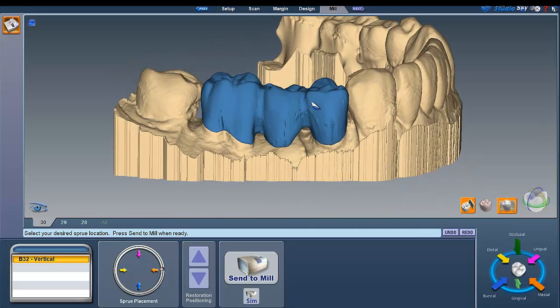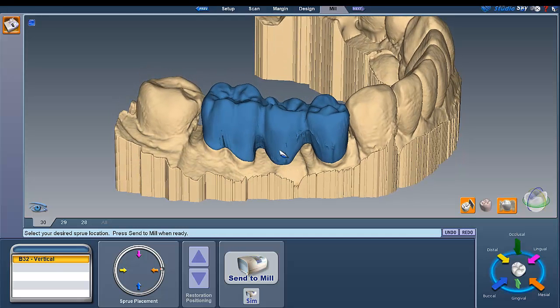And again, first time you're going to see the connectors, and you know, from using the E4D, this is not what your final mill will come out looking like. This is just the simulation. Now, so when you do get the bridge out, a couple of really important things.